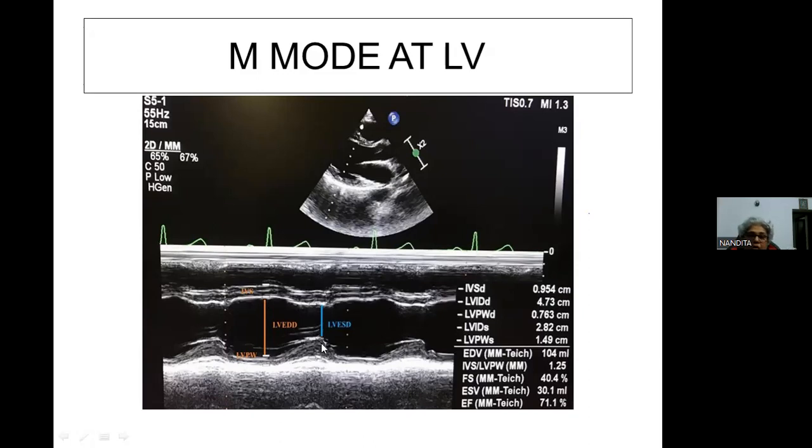No, we're not talking about the entire septum. We're only talking about the boundaries. This particular line. What exactly is this edge, ma'am? How do we define it? Is it the endocardium or something? Like, how do we define edge?